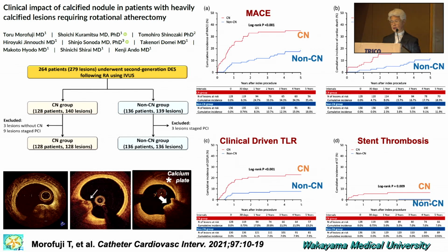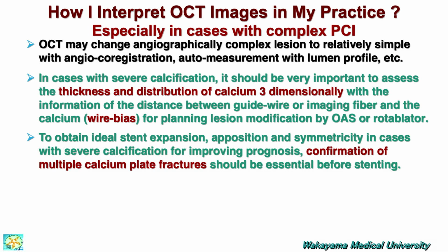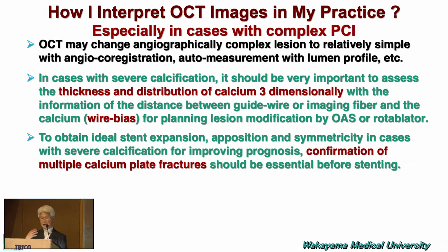Right, so it looks a little bit different, right? But the prognosis is very poor because, as I told you, if there is lots of protrusion at the site of the stent, the stenosis rate is significantly high. So at the moment, we do not have any good solution, but in the near future, yes, we will have.